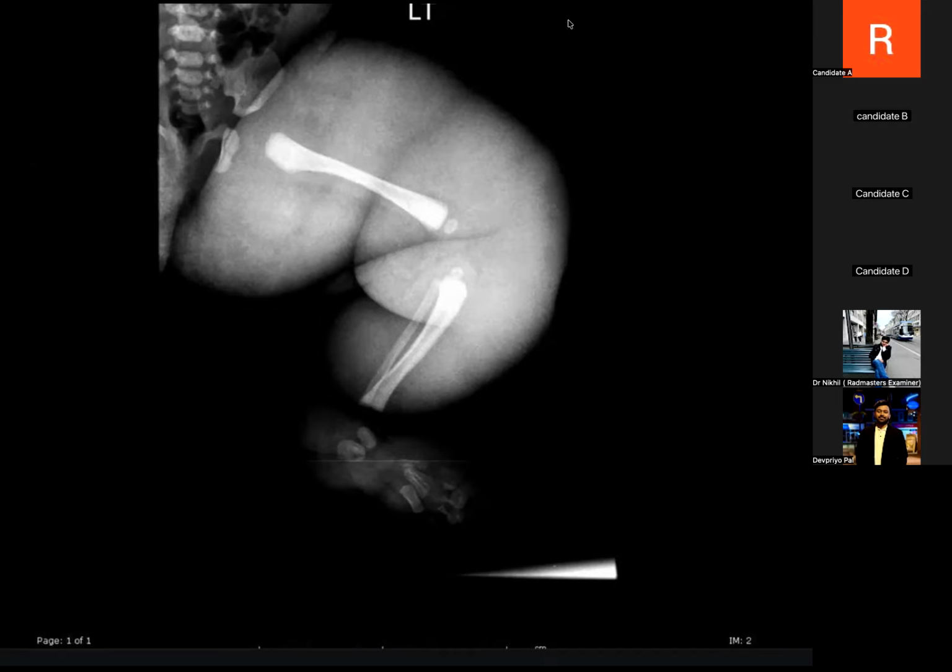I cannot see an obvious calcification or any differential density within it. And I'm looking at the bones. The femur and the fibula also appear diffusely sclerosed compared to the rest of the imaged bones, or carpal bones or tarsal bones. And so in my routine practice, I will review any other orthogonal images if available.